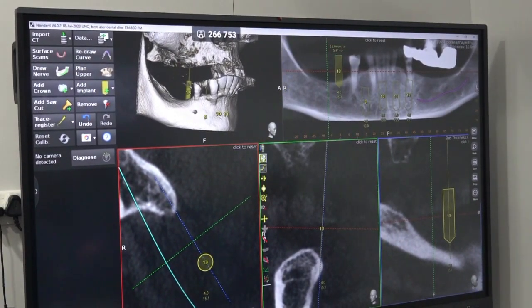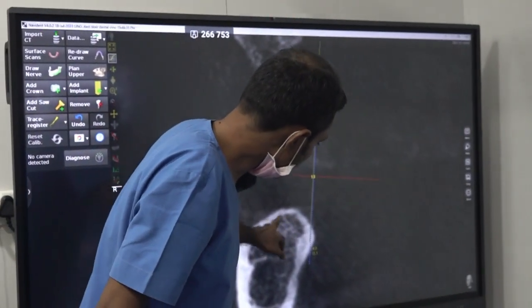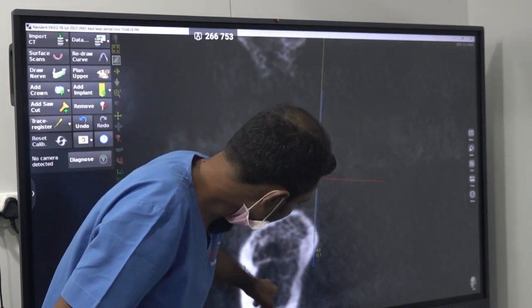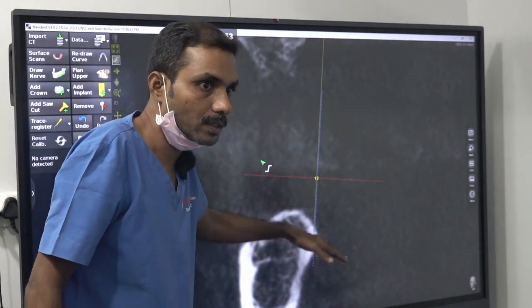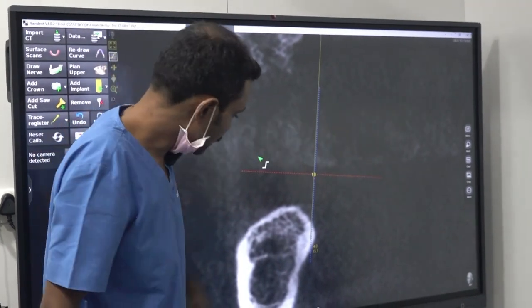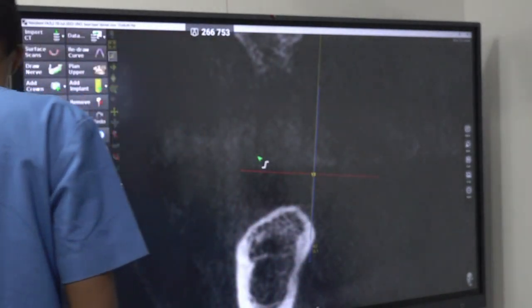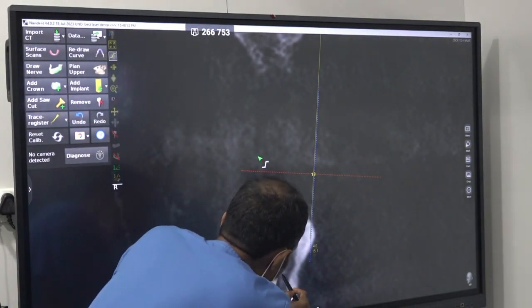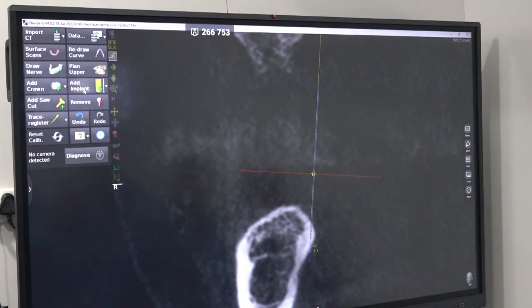This is somewhat more distal. Here the bone quality is better with the custom 5 mm. Of course here it is poor, but if you see, the mylohyoid ridge is more prominent but more upward. But I think I am able to see the canal. Where is it? Maybe this one, right? This one. So we will measure the length.